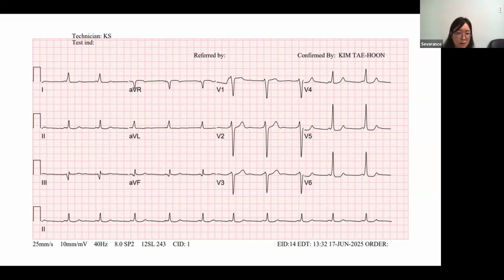So we definitely, according to the ECG, should consider positive. Yeah, and because V1 has a positive delta, according to the algorithm, it should be on the left.